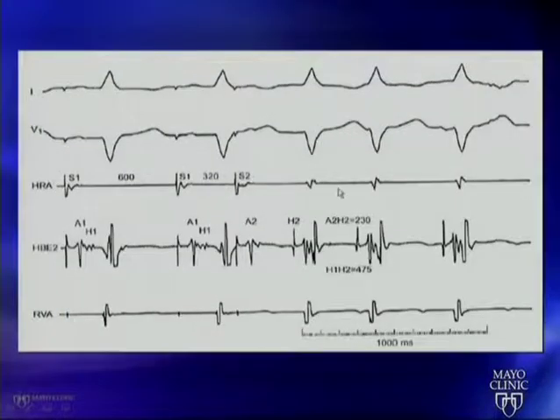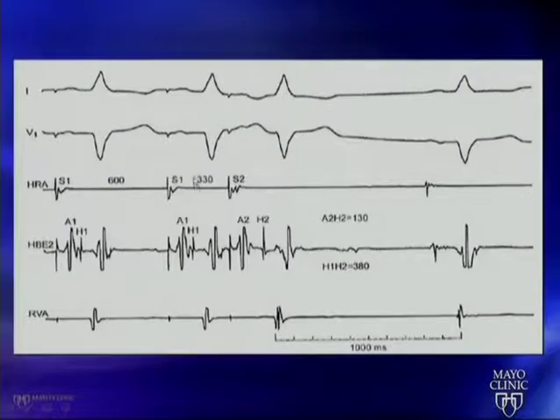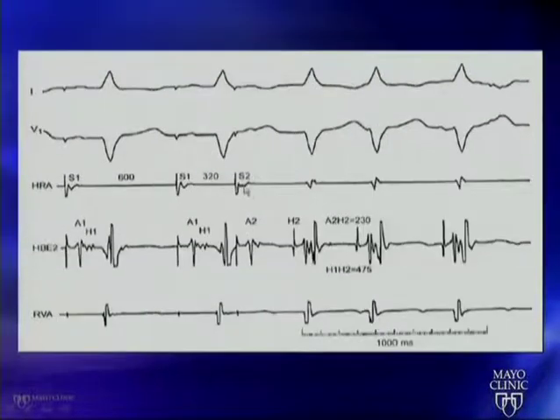But now when we put another PAC, this PAC we put like 330 milliseconds after this paced beat. This one is just a little bit tighter, a little closer, 320 milliseconds. And now notice, huge change in getting through the AV node, and then it's off to the races, start of tachycardia with V and A that are simultaneous.